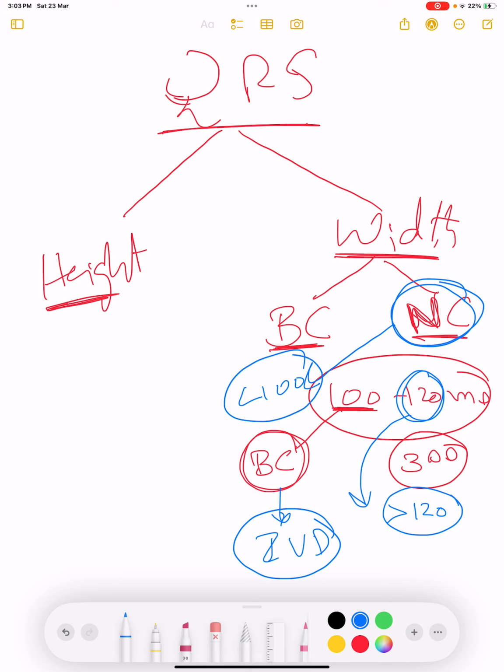There is no lower limit for a narrow QRS complex, because narrow is just normal. Whatever we read in a narrow QRS complex will be normal electrical activity of the ventricle. There will be no abnormality.